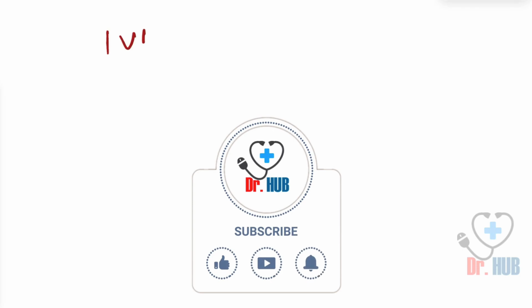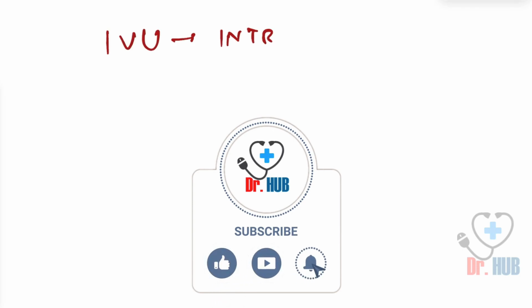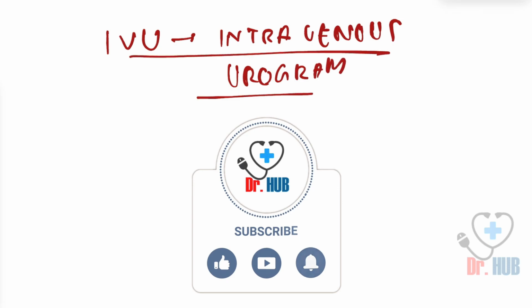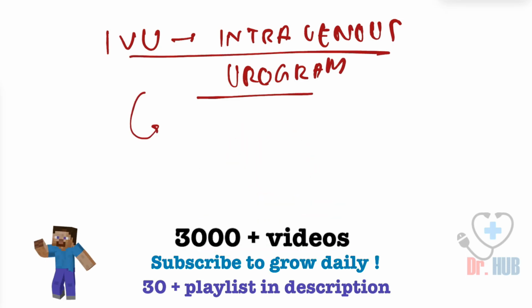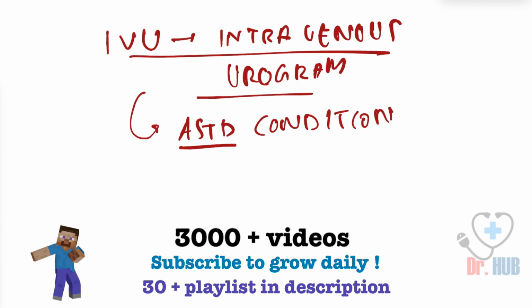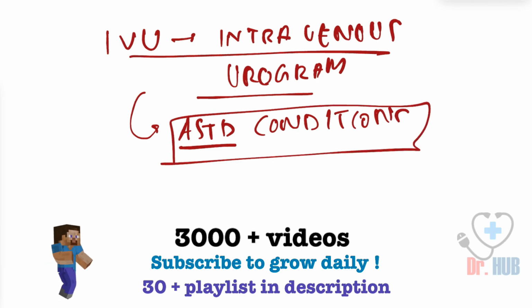We're going to look at the IVU. IVU stands for the Intravenous Urogram. So the intravenous urogram and some associated conditions. How do they appear? This is what we are going to look at. To begin with, we are going to ask some questions.